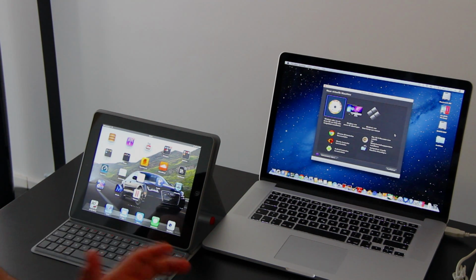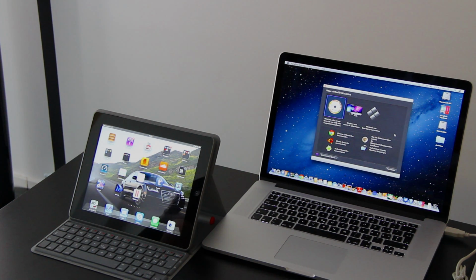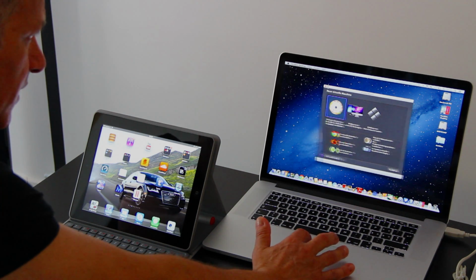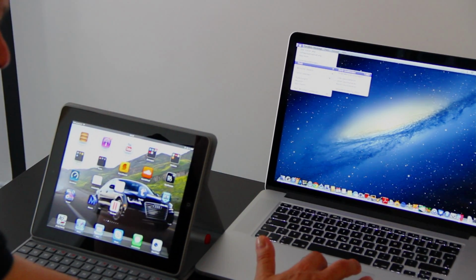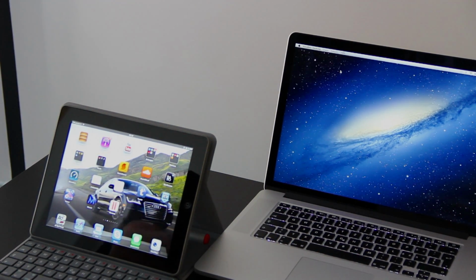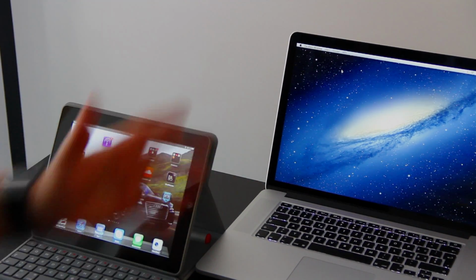All we need to do is start the actual app, because that app will connect any iPad or iPhone on the same network to the actual MacBook Pro or iMac for the lab. So what we do is we've started the virtual machine. We can put this down so we don't have to look at it. Also we need to get rid of the dock, because the dock just stands in the way of our wonderful Active 2 software. So we get rid of the dock so we don't see anything. Now we see the desktop on the iMac or on a MacBook Pro, such as this now.